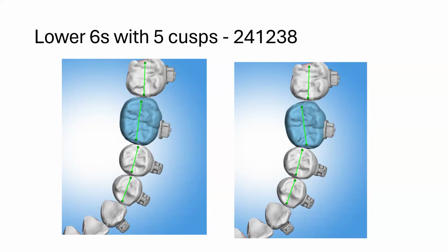Yeah, absolutely. So for anterior teeth, that's basically how I look at it. And Steve, just like you said, for posterior teeth, I take the occlusal plane and tip it up a little bit so that I can see how those palatal cusps are flowing. Every once in a while, you'll have a second premolar or first molar where the flow of those cusps is just off, and there I will go in and customize that torque so that it flows well with the rest of the teeth. With the Pitts system, there are a few things you need to be very careful of.